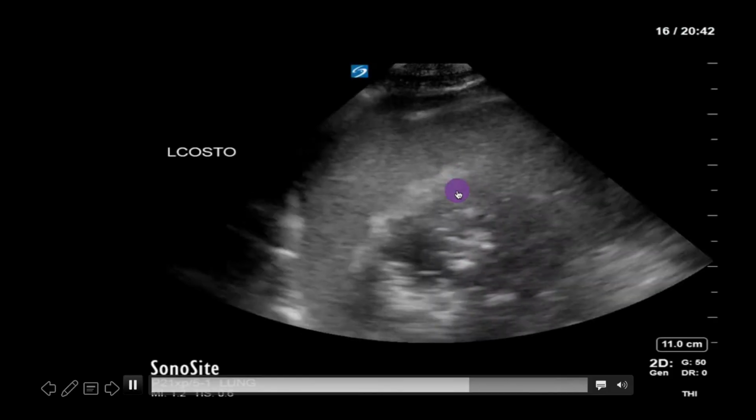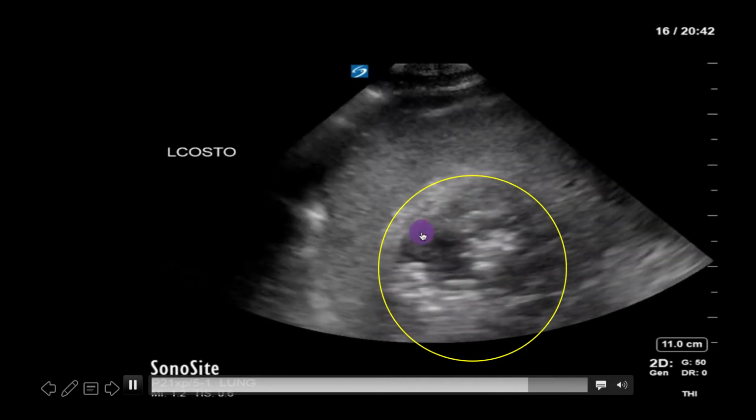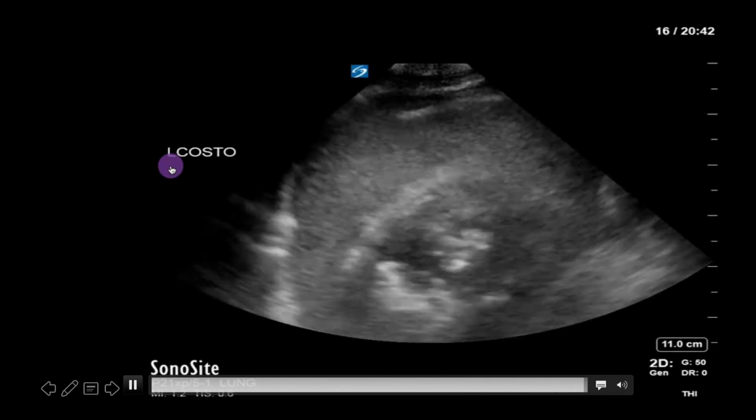One important mimic of air bronchograms to know is air within the stomach, but again, this will be under the diaphragm and devoid of blood flow around the air. It is also much more likely to be on the left side.